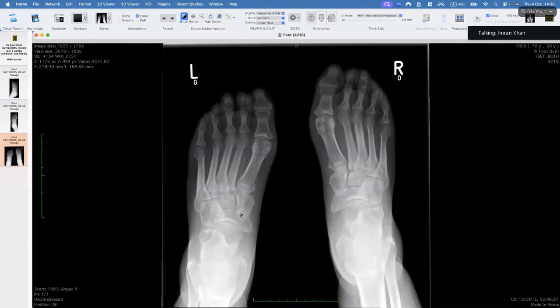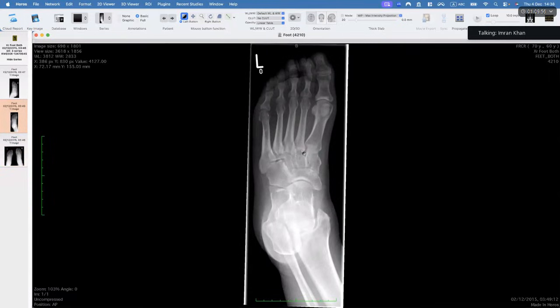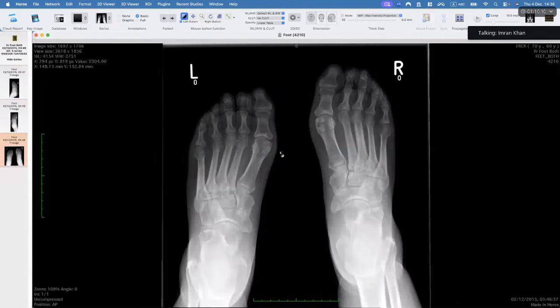This is not osteoarthritis. I don't see any osteophytosis. I don't see any other evidence of osteoarthritis. I know it's not a typical location, but that's the whole point. I need you guys to think a little bit differently, right? These are visible on the oblique views as well. That's why I put them up. This is erosion. This is not subchondral cystic changes. This is not typical for subchondral cystic change and osteoarthritis. These are actually erosions. This is gout.